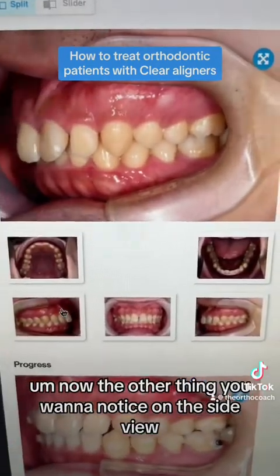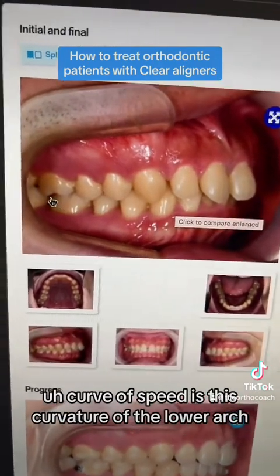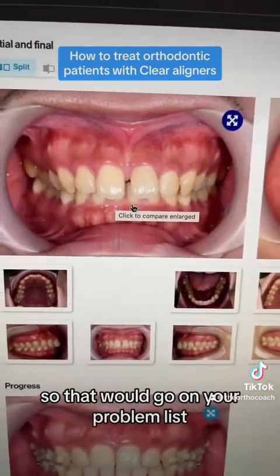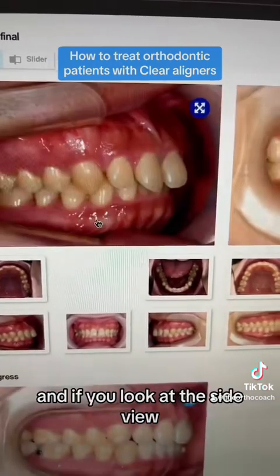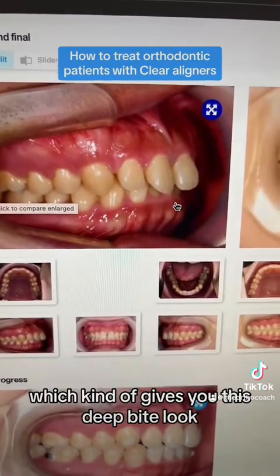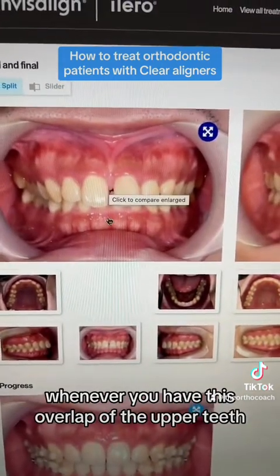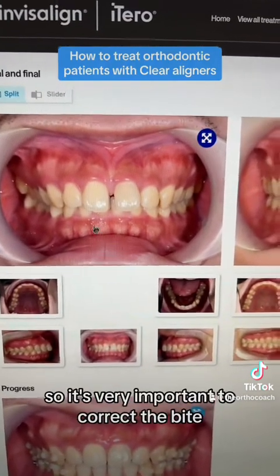Now the other thing you want to notice on the side view is that this patient has a really deep curve of Spee. Curve of Spee is this curvature of the lower arch, and that creates this deep bite, which we already talked about. So that would go on your problem list: this patient has a deep bite because the upper teeth overlap the lower teeth. And if you look at the side view, this patient has a deep curve of Spee, which gives you this deep bite look. And deep bite look makes you look older. The youthful look is lost whenever you have this overlap of the upper teeth overlapping the lower teeth, which kind of makes you look older. So it's very important to correct the deep bite.